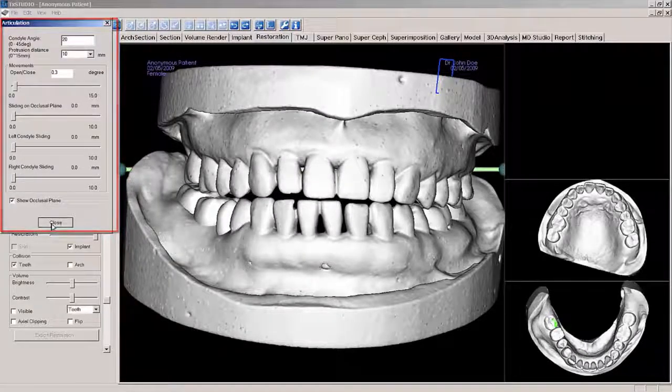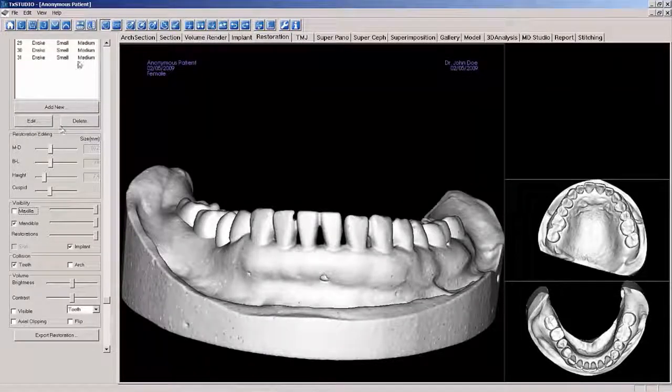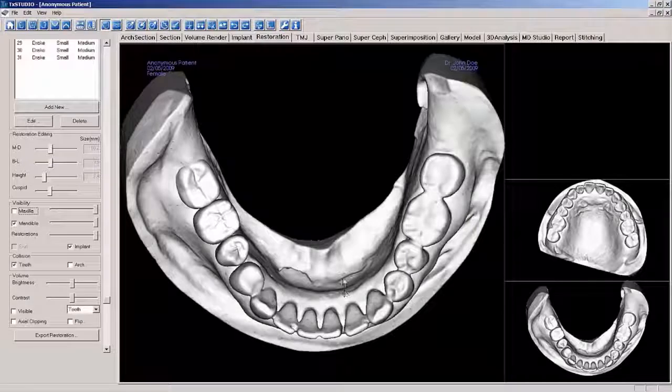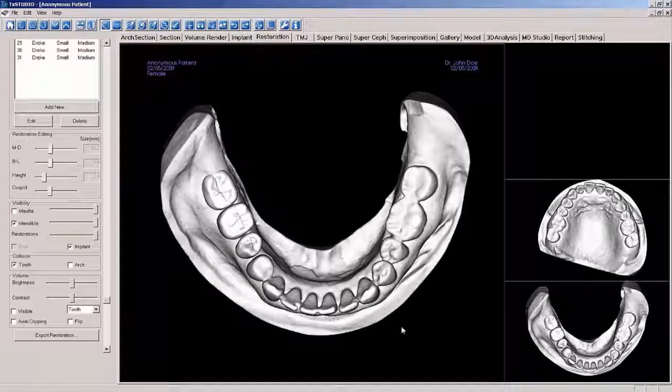Next, let's take a look at the 4 tools for shaping of the crowns. These tools will edit the crown's mesh. A quick definition for mesh would be a collection of vertices, edges, and faces that create a polyhedral object in 3D computer graphics. For our present purpose, the polyhedral object is a crown.